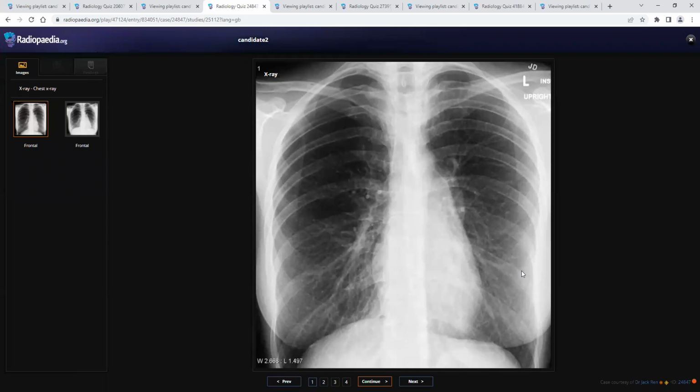And otherwise, the lung fields show reticular shadows mainly in the lower zones, cardiac shadow is normal, and there are slightly preserved or even mildly enlarged lung volumes, no hilar enlargement, and the bones are fine, I think.